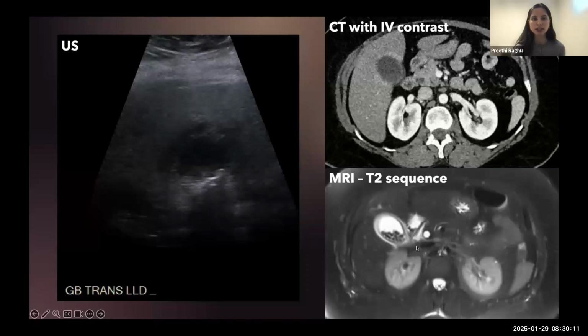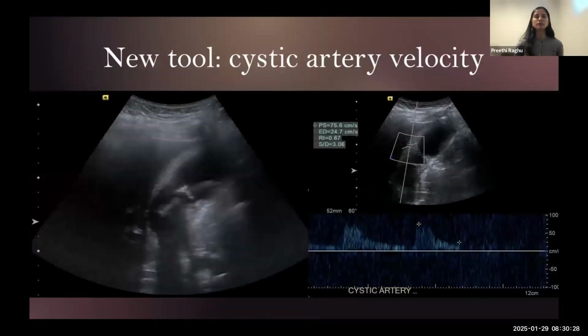And then look at the drastic difference with the MRI here, where we can see that there are numerous gallstones, same as what we saw in ultrasound, and that, yes, in fact, there is circumferential mild wall thickening. So this patient went to OR and did have acute cholecystitis.